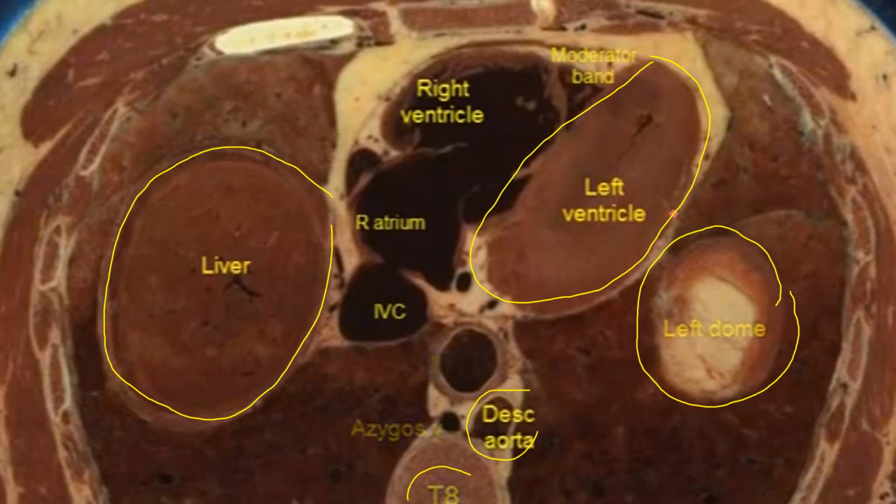Here we're around T8, T-spine 8, esophagus much bigger as we get further and further down. Inferior vena cava much bigger as we move down, right? So this is just showing you what it looked like as we're moving down and down and down. So when we're looking for diseases that affect mostly the bases, like ARDS and things like that, this is sort of that screen where you're going to see most of the atelectasis. You're going to see most of the lung compliance problems, as far as decreased compliance, down here towards the bases.